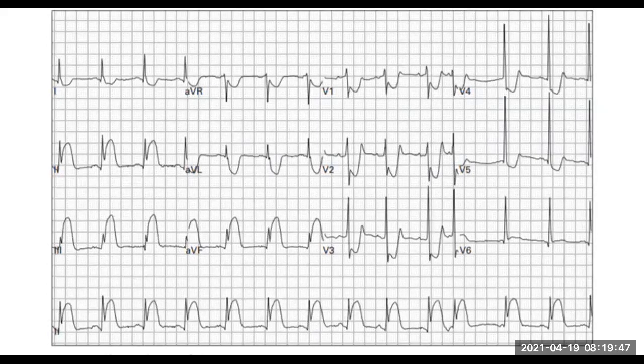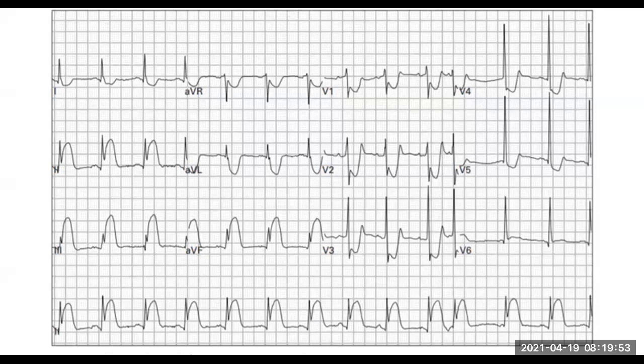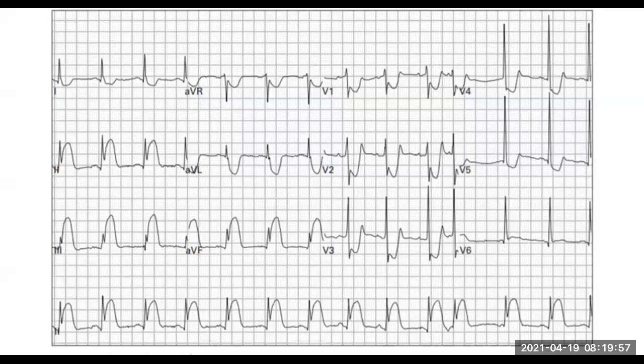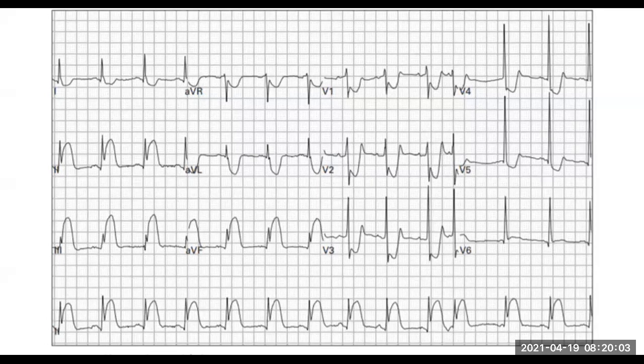All right. So you're not sure, because there's a few differentials that are popping around with it. So the first thing that you need to do is that you go and you do an ECG, because you want to make sure, is this cardiac or not cardiac? Because cardiac and pulmonary embolism are going to kill your patient quite quickly. And if you can rule those out, then you've got time to check for the others. Agreed? All right. So let's look at the axis first of all.